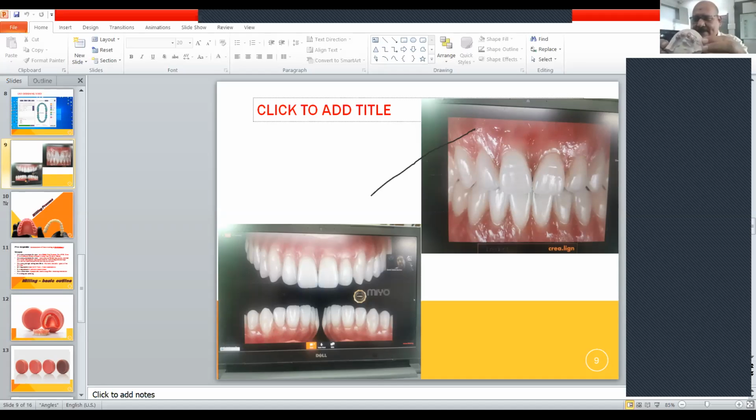I think we'll go for custom abutments, because you can see on this side, the angulation is a little over 28 degrees. So let us design a custom abutment. That also can be exciting, but we can show both. It doesn't matter. First custom abutment, then on the same model we can show the bar for hybrid denture purpose, a milled bar in titanium, and prepare that bar for hybrid denture purpose. So we do a CAD design.